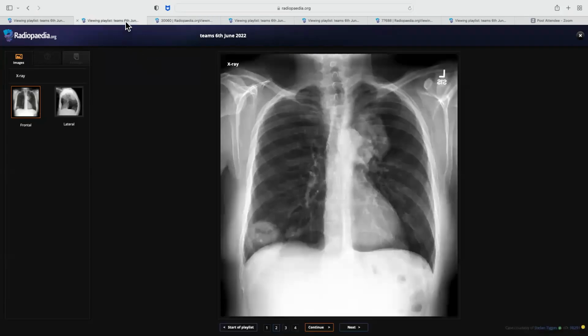So that was fine. And this one, yeah, you told that these are cavitary ones. Basically, one thing you could have done in this case was quickly come, rather than describing every lesion, broadly say there are multiple cavitary lung lesions. You could see one lesion in the right lower zone.